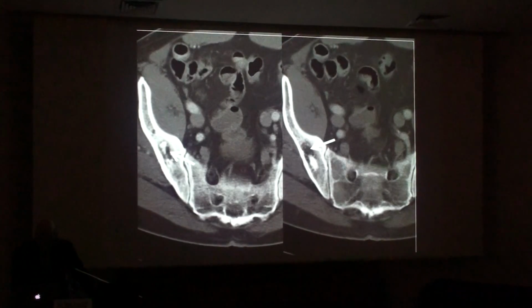We see fat, we see bone, which sometimes is called ischemic ossification, and it can be called even an infarct by those not familiar with the radiologic appearance, but I would contend that these are just intraosseous lipomas with areas of involutional change, in this case, ossification centrally. And we see this with at least modest frequency within the pelvis, and I think it's very characteristic. And again, you can see the ossification within.